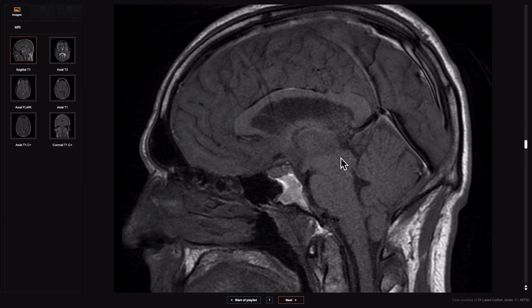The floor of the third ventricle has been pulled down. The mammillary body is drooping closer towards the pons, and generally you get a brainstem anatomical distortion. The pons appears flattened in its ventral surface. There's also evidence of cerebellar tonsillar descent, so evidence of brain sag.